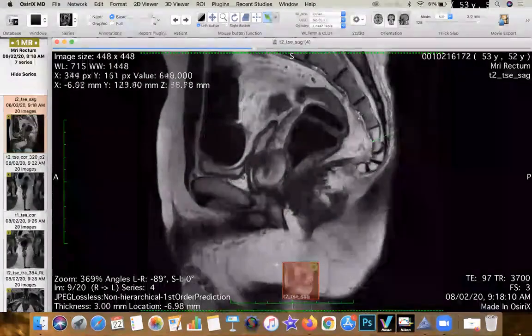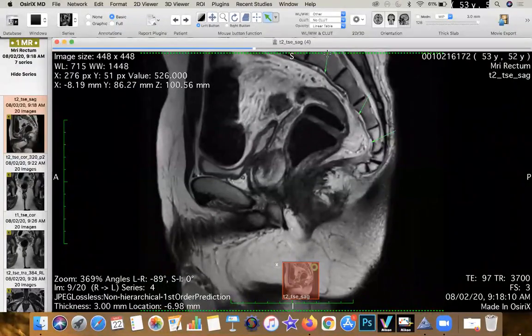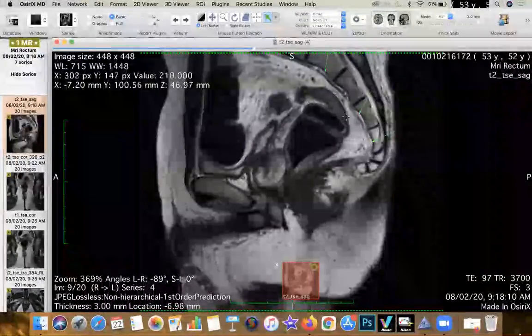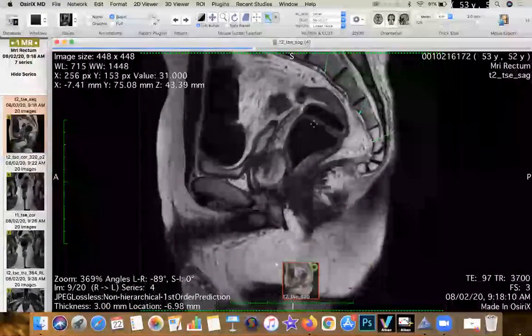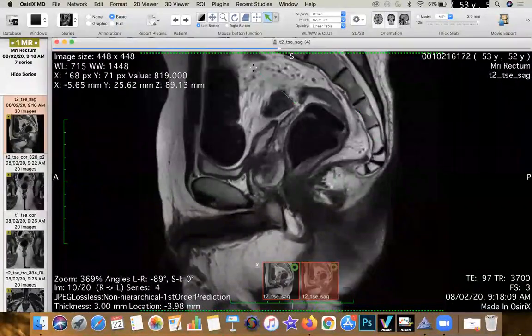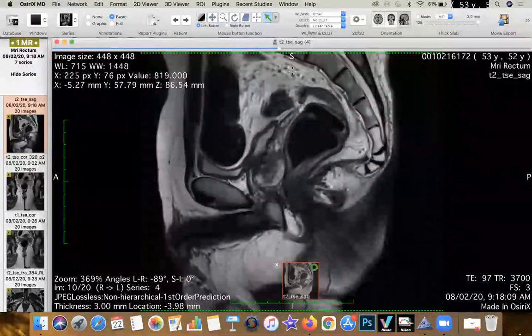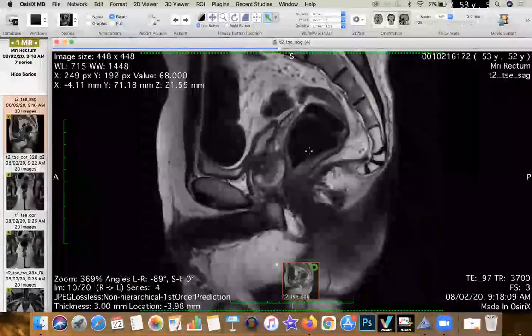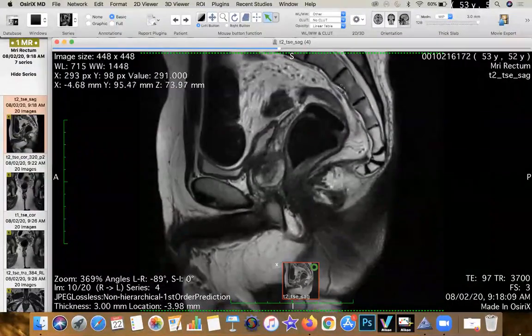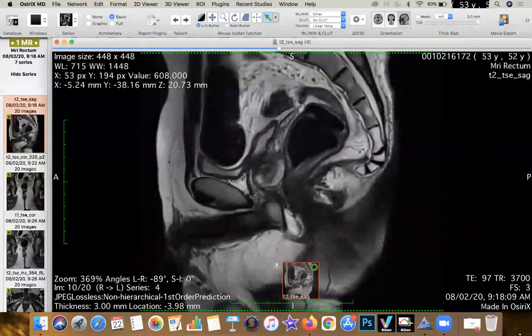This is the presacral fascia, also a continuation of the parietal endopelvic fascia. This structure, which envelops the mid-rectum, the fascial reflection, is the mesorectal fascia. And if you remember my previous lectures, this is the anterior peritoneal reflection. So you have the true peritoneal space, you have the subperitoneal space, which is contiguous with the retroperitoneum, and then you have the extraperitoneal space, which continues with the properitoneal fat pad, the retropubic space, and so on and so forth.